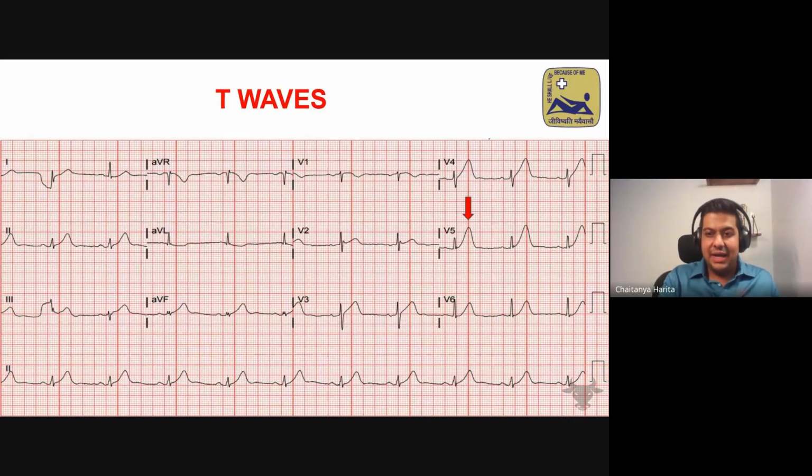And I think to myself, either there's hyperkalemia or the patient is having acute MI. I can remember at least 5 or 6 incidents where I've asked them, is there any risk factor for hyperkalemia? No. Dialysis? No. CKD? No. Chest pain? Yes. This is a tall T wave suggestive of possibly myocardial ischemia.